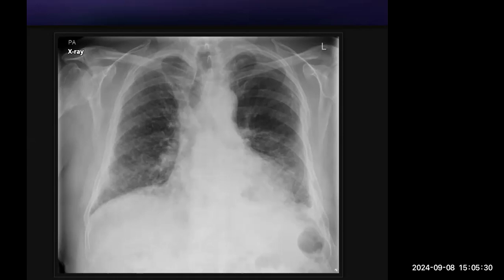I would inform the findings to the referring clinician and refer this patient to the respiratory physicians for further review, and compare with any previous radiographs to see for progression of the disease. And suggest a contrast HRCT of the chest to further characterize the findings, and discuss in the lung MDT meeting, the ILD meeting as well. Because there's some cardiomegaly, I would suggest an echocardiogram.